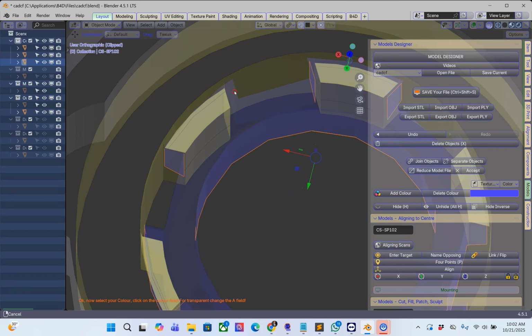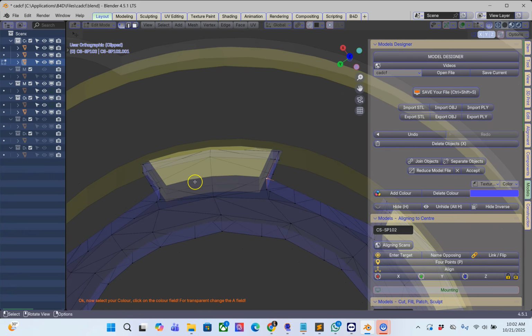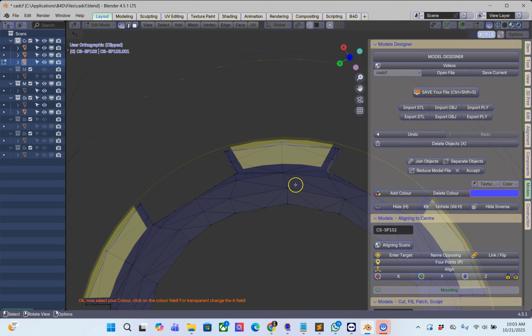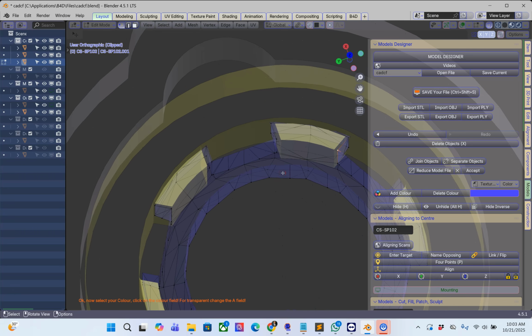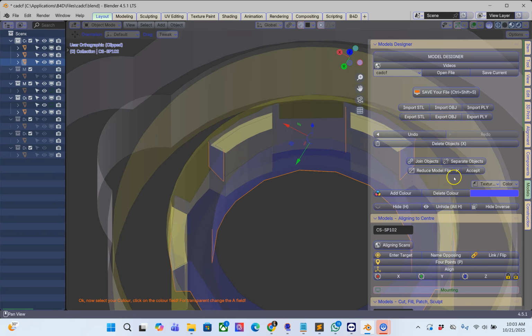Now let's have a quick look. In edit mode, we can see that this one is right on top of the anti-rotation. Surely this one should be in this location, and it's not. And unfortunately, I wish there was a standard where we'd all be using the correct parts and all of the correct alignment. Unfortunately, that's not the case. So you can see that we need to rotate this, and usually it is a 30 degree.